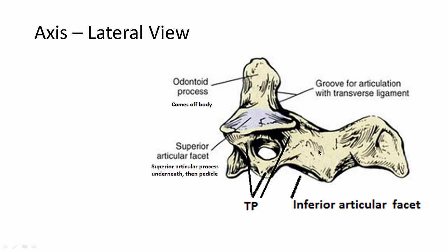Side view, I think we covered all this. You can just see the transverse. This is all transverse process though, because the transverse process gives rise to this transverse foramen.